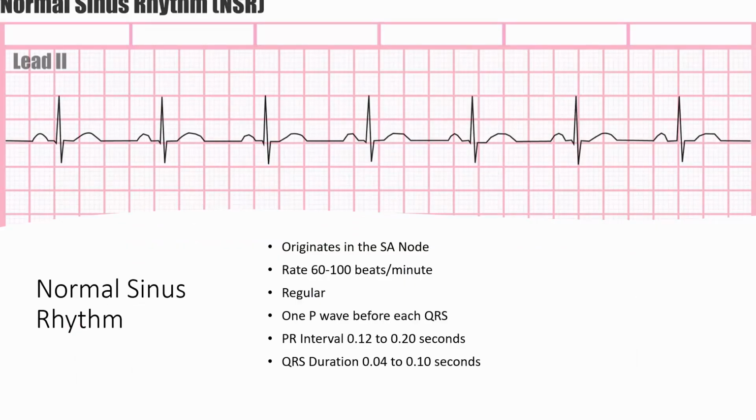The first rhythm I want to talk about is normal sinus rhythm. I hope that this is what all of us are in, because this is what we should be in. If you were doing your 5-step method, this is what you would find.